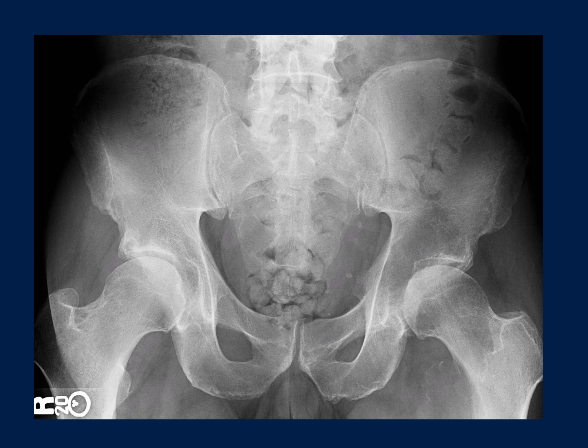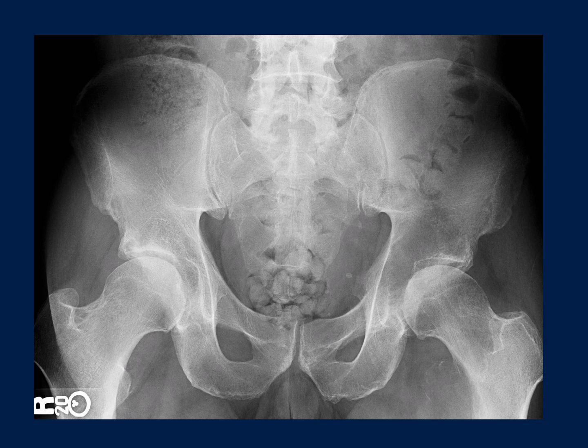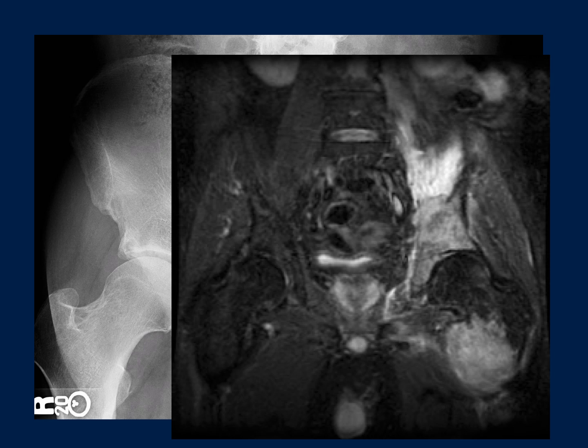Metastatic disease can be obvious or subtle radiographically. If you look at this film and try to see the finding, you'll see that there is a destructive lesion in the lesser trochanter. But there is also another thing, and that is the destructive lesion in the acetabulum. So some of these can be pretty subtle radiographically, and if you were to do an MR, you'll see that it's much easier to see these lesions. They really stand out.